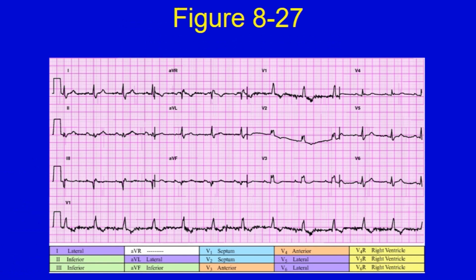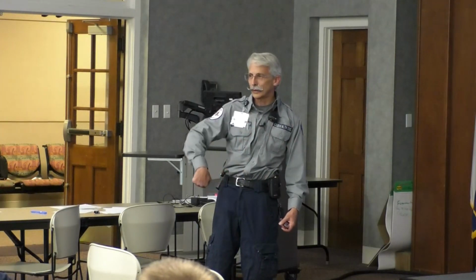The nurse showed me that one day. We were not looking at V1. We had not done a 12-lead. And she goes, oh, look, a right bundle branch block. I went, whoa, stop. How did you know that? She goes, this big swoopy S wave down here. Okay? And there's a big swoopy S wave here because it's moving away, and anything moving away is a downward deflection, and it's moving away slowly.